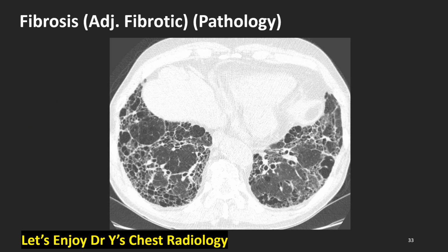Fibrosis pathology. CT scan shows bilateral pulmonary fibrosis of an idiopathic pulmonary fibrosis patient.